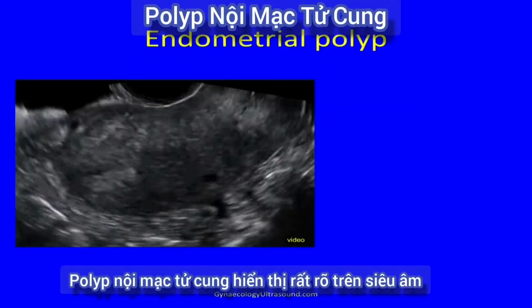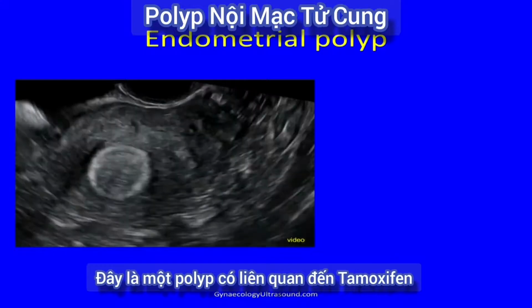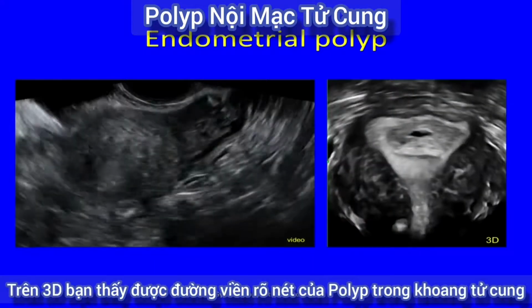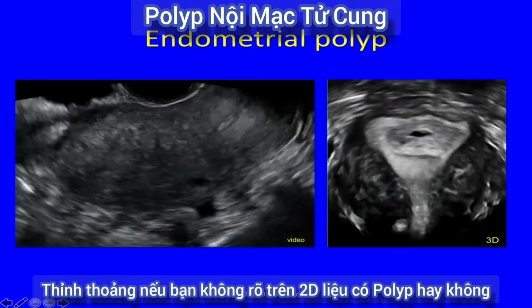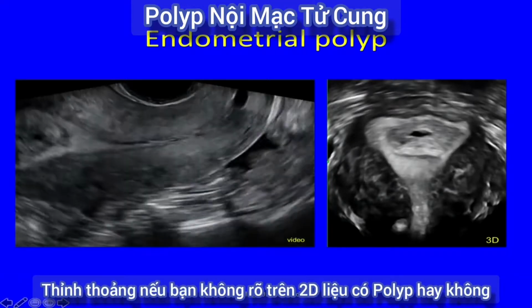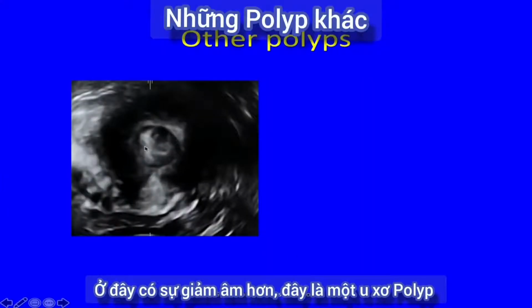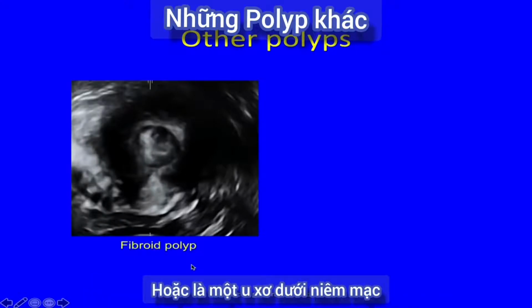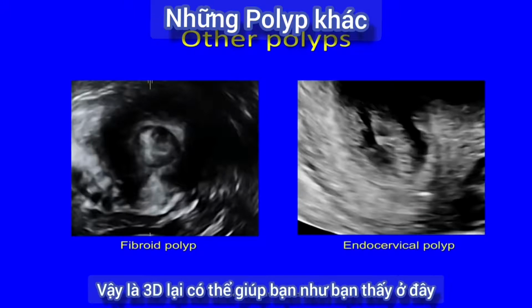Endometrial polyps show up very nicely on ultrasound. So this is a tamoxifen related polyp, and on 3D you can see this really nice outline of the polyp in the cavity. So sometimes when you're not sure on 2D if there's a polyp, 3D can really help you. And of course there's different kinds of polyps. So this is more hypoechoic. This is a fibroid polyp or a submucosal fibroid. And this here is a small cervical polyp. So again, 3D can help you if you look.